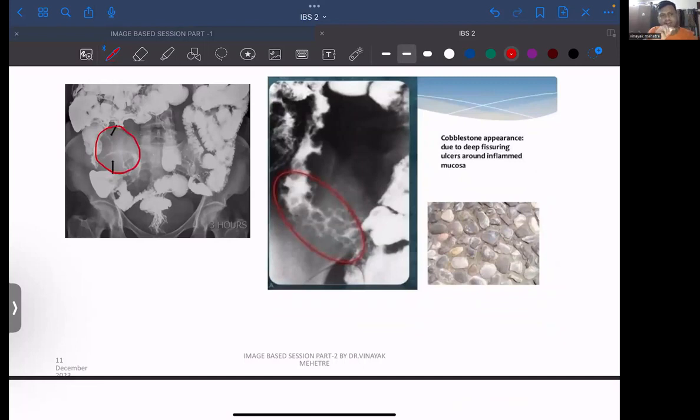There is one white line. बाकी तो समझ में नहीं आ रहा है. I know that. Okay, ऐसा लग रहा है intestine में कुछ डाला है and whole of the intestine we are able to see, but somewhere we are seeing the whitish lines, that is called as string of cantor. One liner सबको आता है, I know that. String of cantor.